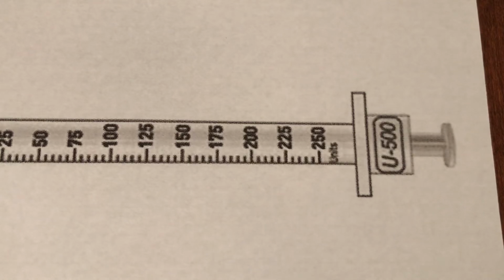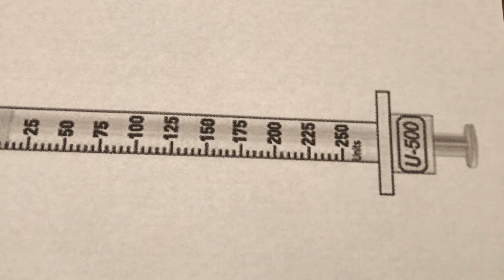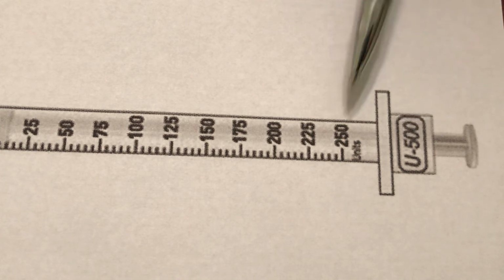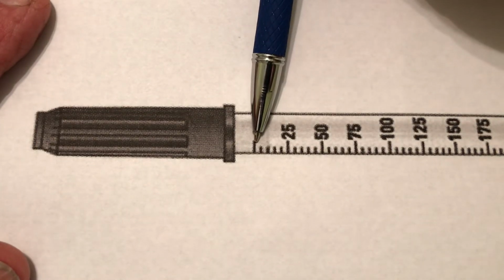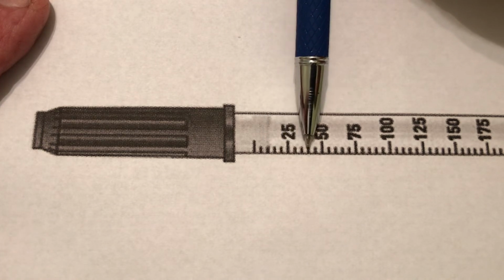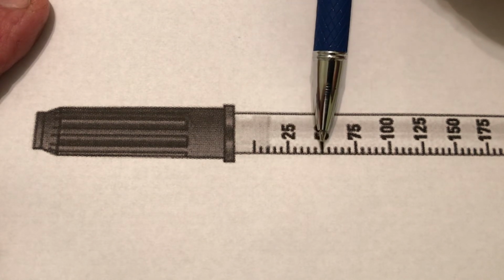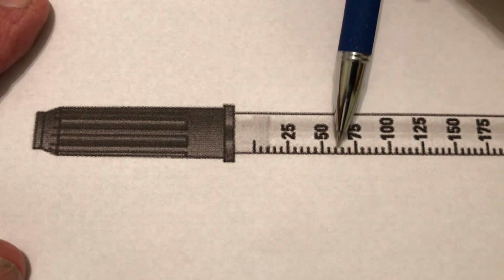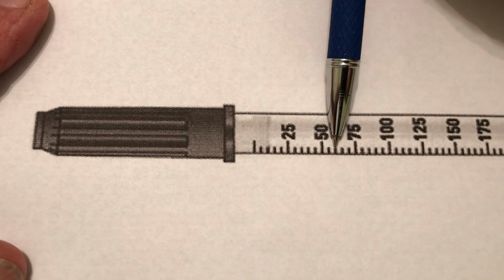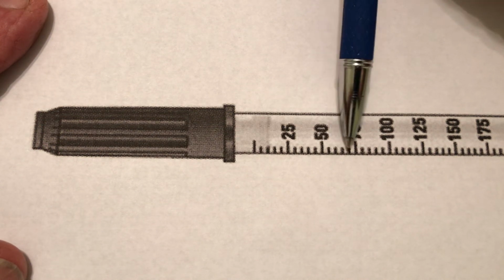Well, let's look real fast at this U500 syringe. And you only, let me say it again, if you have U500 insulin, you have to use this kind. Now look at the numbers. Wow, big numbers. There's 0. Look at this, that's 5, 10, 15, 20, 25, 30, 35, 40. Each little teeny mark here is an increase of 5 units. So what would 2 marks past the 50 be? That's 60. Okay, 50, 55, 60, 65, 70, 75.